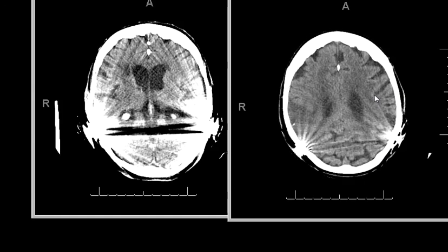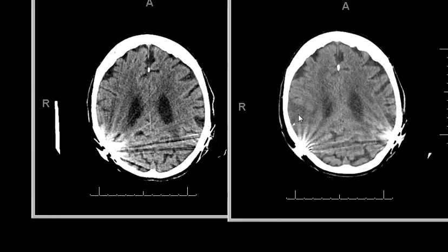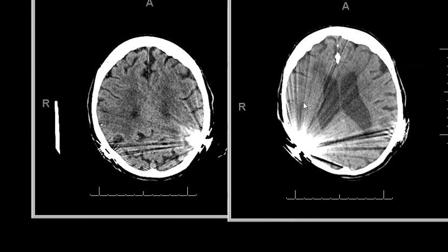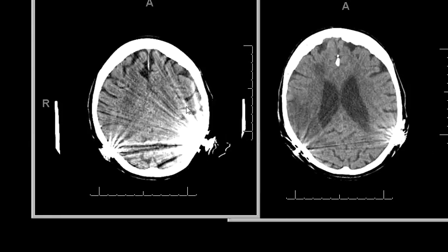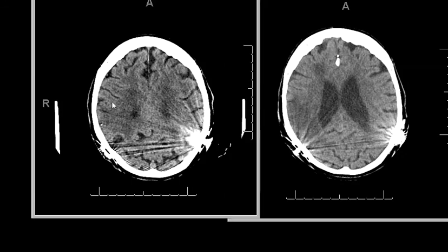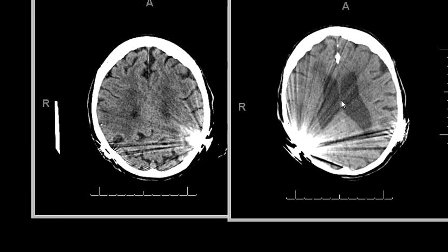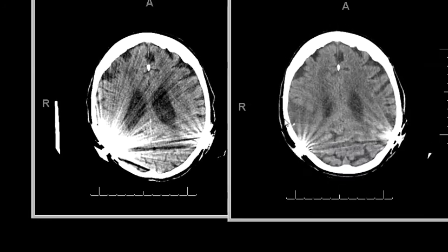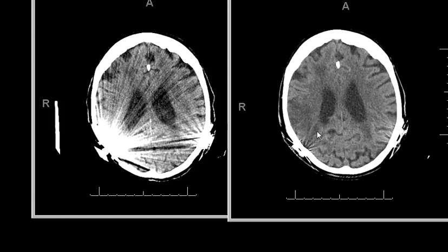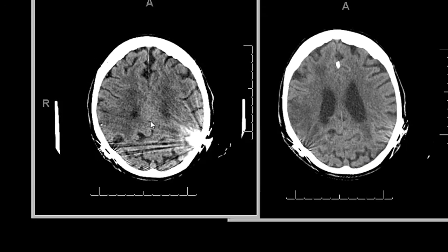Of course, the patient has a lot of chronic white matter disease. It's hard to tell, but probably this is the newer, more recent stroke that has evolved since this study, which is March 10th, and this is March 13th, 3 days later. So there is evolution of stroke involving more of the posterior frontal parietal region that wasn't that way 3 days ago.